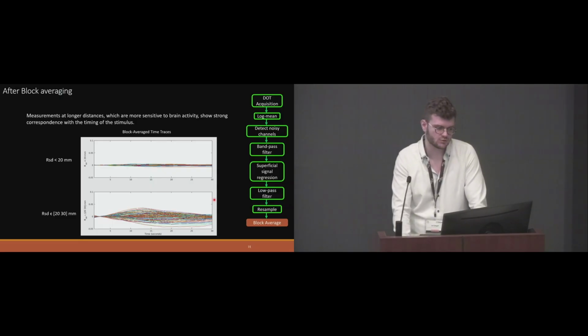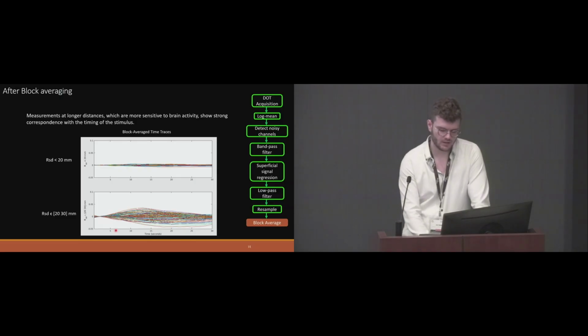brain activity and show stronger correspondence with the timing of the stimulus. Here we can see a little bit more blooming of our time traces compared to our shorter source detector distances.